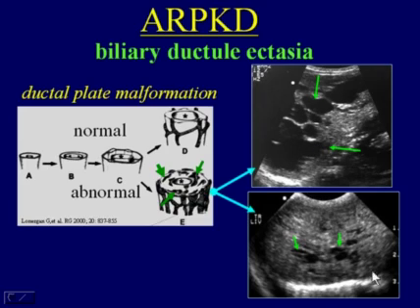This was an older child who had a very dense echogenic liver, likely due to hepatic fibrosis, but some of these holes that you're seeing in the liver here are not vessels, when in fact they are actually evidence of biliary ductal ectasia with a central portal vein here.